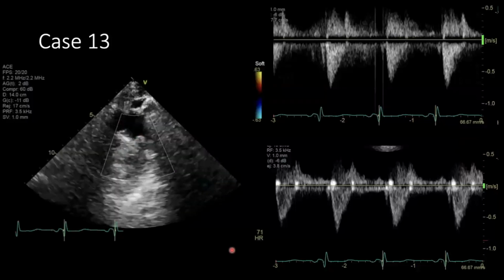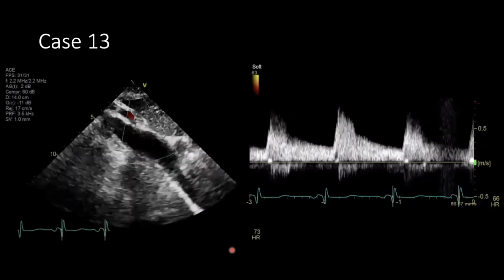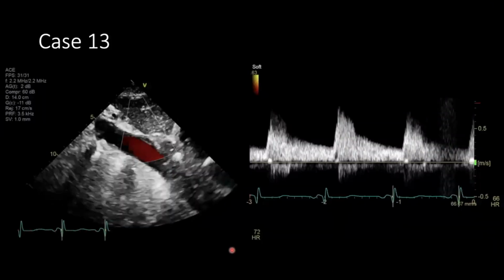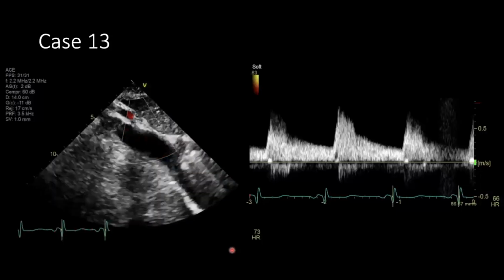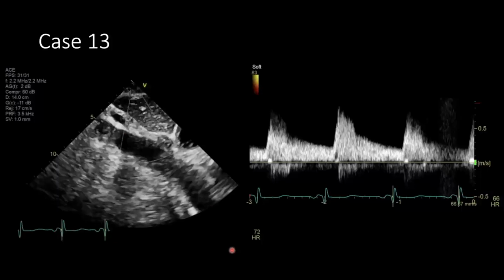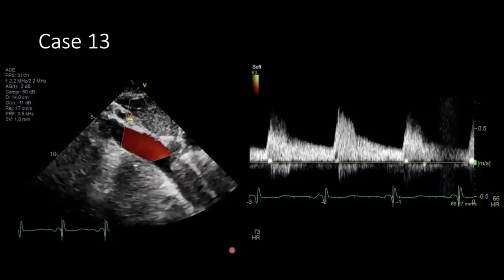And then I have a couple more pictures. Save the best for last. This one and the next one, if I can. I don't know if I have time, but we'll see. Dr. Leon Poy's favorite. So this is the abdominal aorta, same patient, and a spectral Doppler from here.